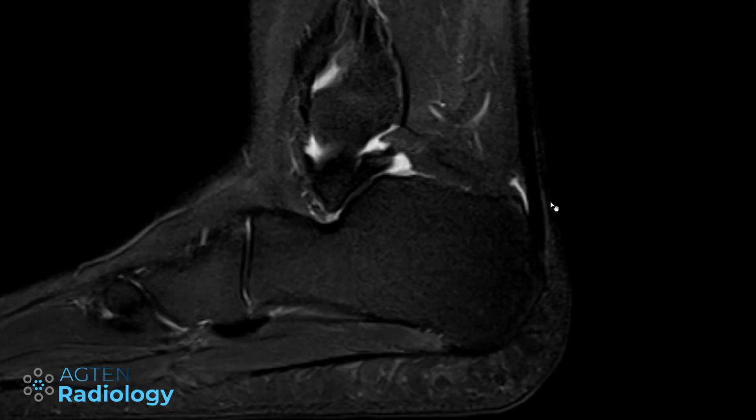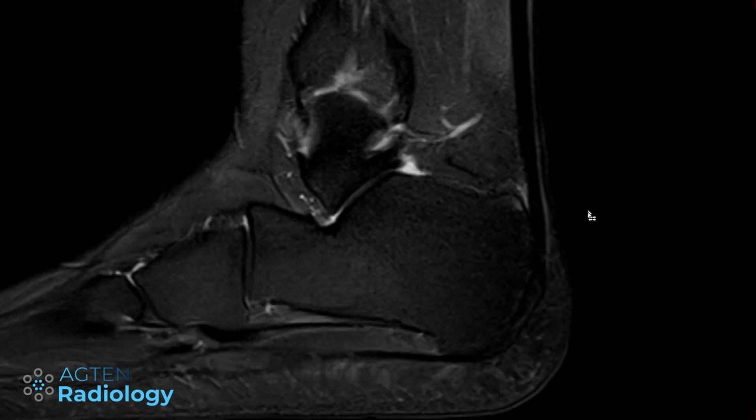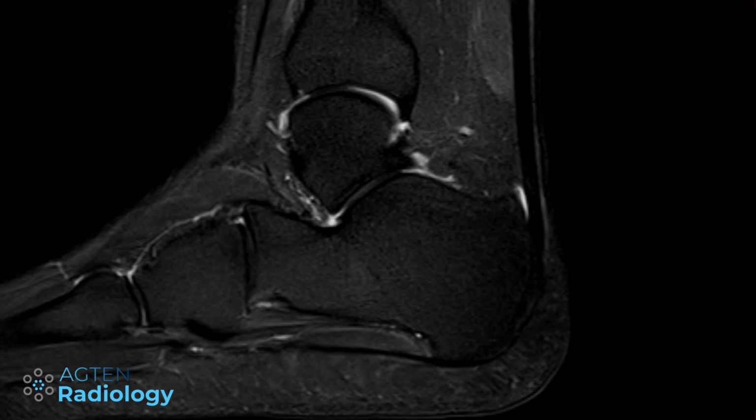So let's go back to our first case, or the initial case that I have shown you. And now, if you see this, you might be inclined to say it's just a normal amount of fluid in the bursa. Now, I gave you the measurements, and although image quality has improved a lot and the measurement bias or error in the mentioned study was probably higher than we would have it nowadays, if we do the measurements, we get here maybe up to 8 millimeters, so this is higher than the threshold of 7 millimeters mentioned in that study.